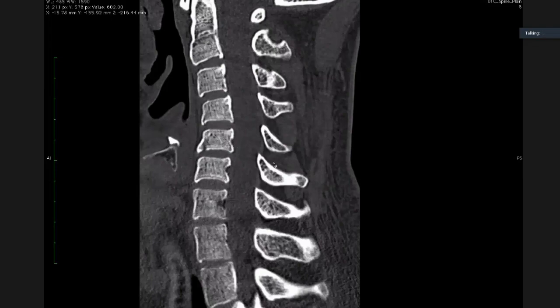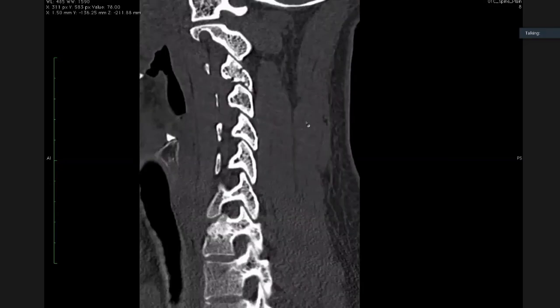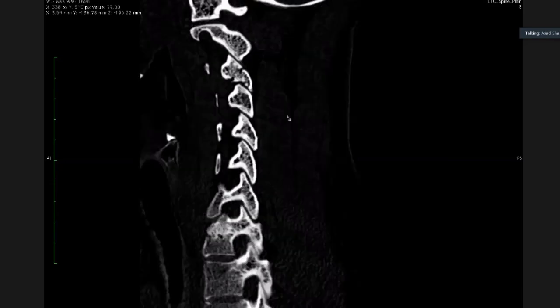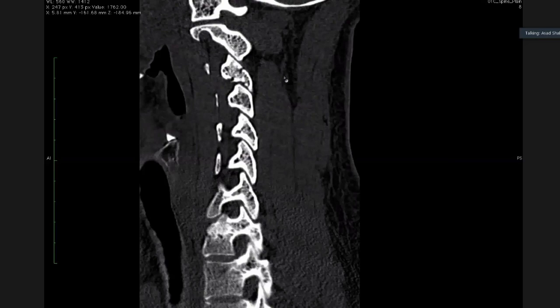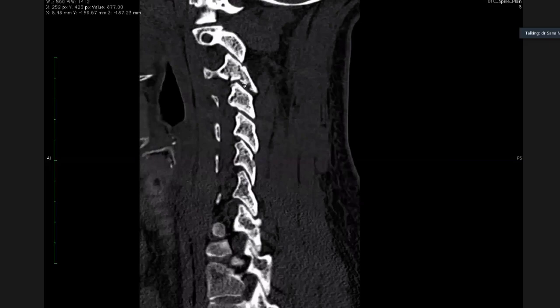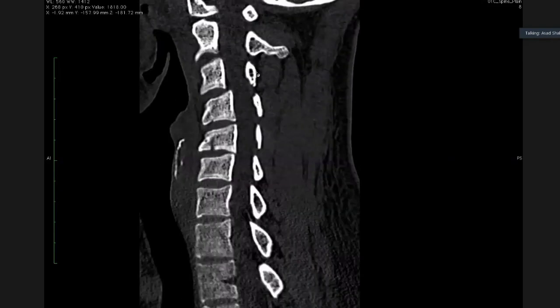And there was another thing, isn't it? Yes. So where is the fracture? This is your C1. This is your C2. So where is the fracture? Then the spinous process. Right here. It's not a spinous process. It's the articular pillar of your C4. Yes, sir. Superior articular facet. Sorry, C3, beg your pardon. This is your C3.